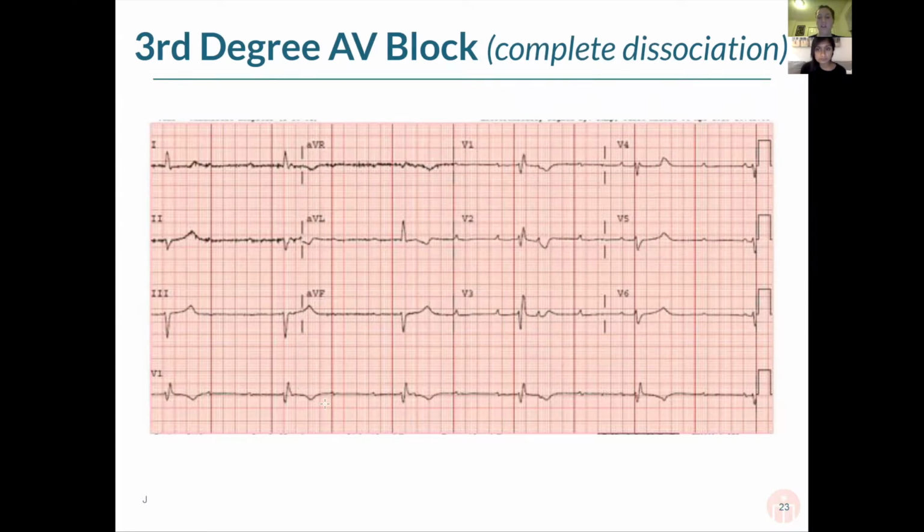But if you even look at a lot of QRS complexes, they don't even really have a P wave right in front of them. And so that makes it a lot less likely that it's a 2nd degree heart block. In some places you might even look like here, I don't even really see a lot of P waves. So that's what makes it tricky.